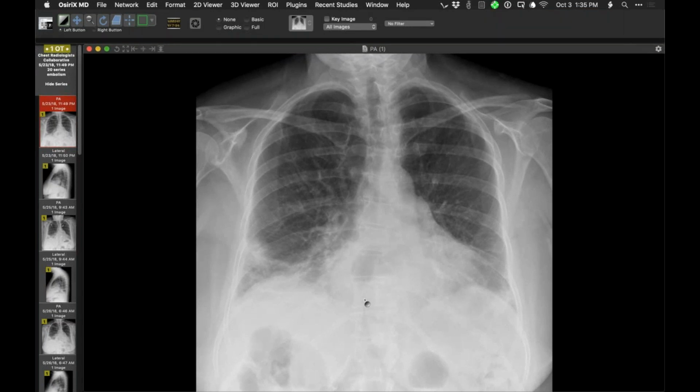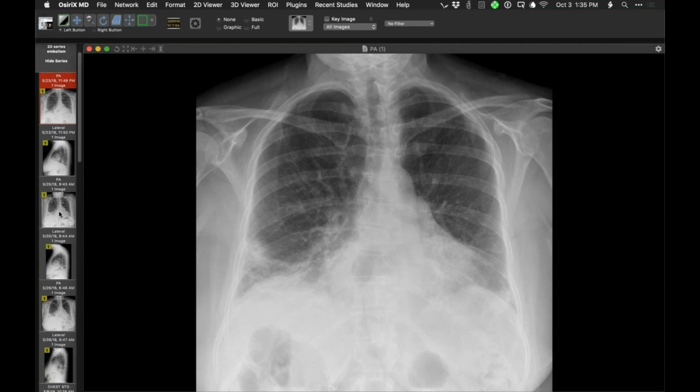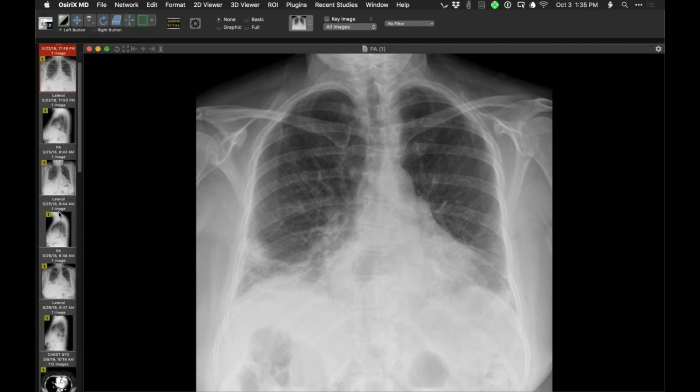At this time, she's got an esophageal hiatus hernia. I don't know what these basal lung opacities represent. They may just represent areas of atelectasis. Certainly in the context of pulmonary hypertension, without additional history, particularly if the vessels appear very abnormal, one might think of findings of CTEPH, at least in the sense of peripheral infarcts, perhaps. So that goes back to 2018, last year.